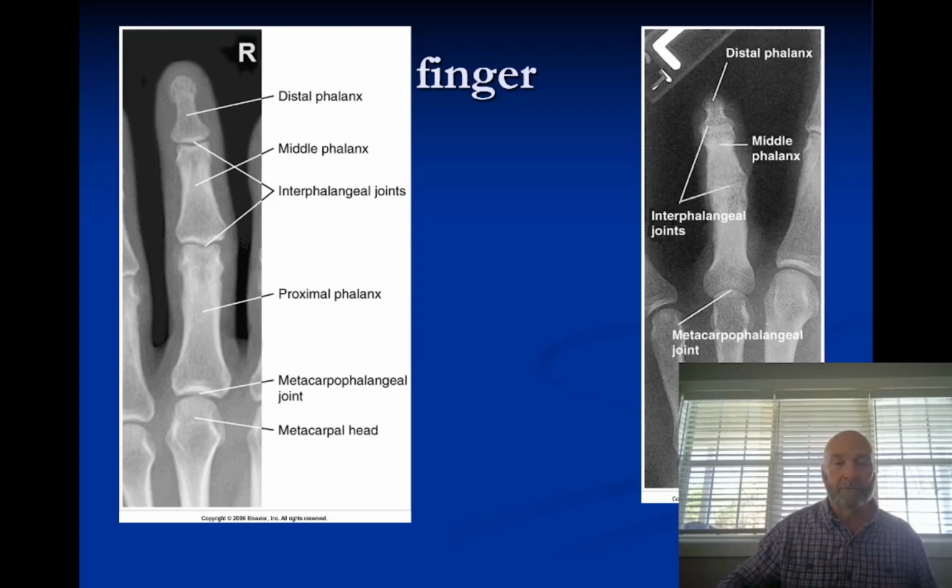Their fingers will sometimes be a little bit deformed because the articular ends kind of eat away, and they might not be able to straighten their fingers out. Also, because of trauma, they might not be able to straighten their fingers out as well. But that's what a closed joint space is going to look like as opposed to an open joint space, and that is because our joint space is at an angle to our central ray. It's not perpendicular to the image receptor, and it's not parallel to the central ray.